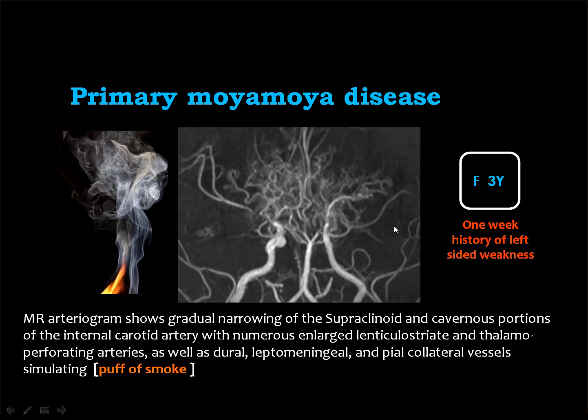And you get too many, very small vessels, resulting characteristically in this appearance. If you see this, you diagnose easily that you are dealing with Moya-Moya disease, because of the obliteration of the branches of the internal carotid on the left, and also on the right side, you see only the internal carotid itself.